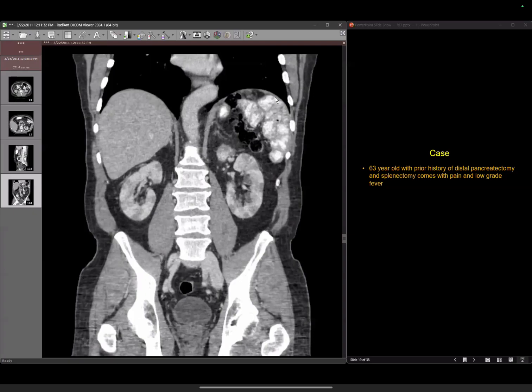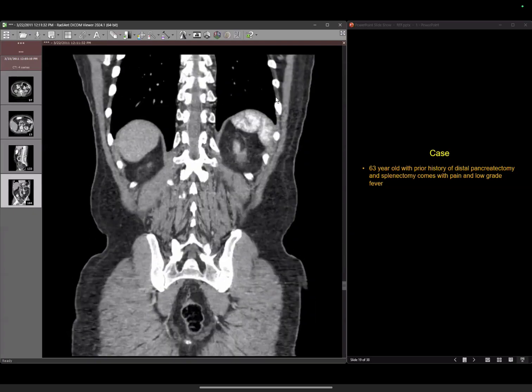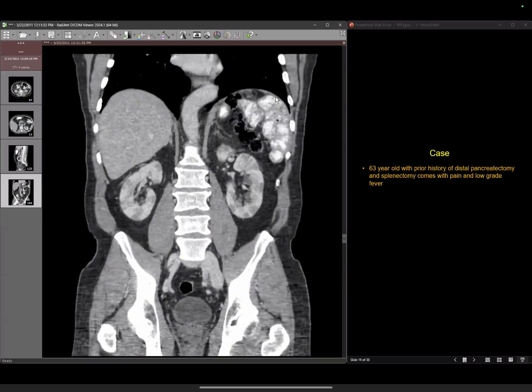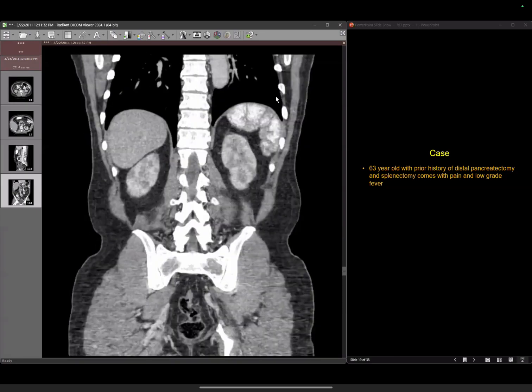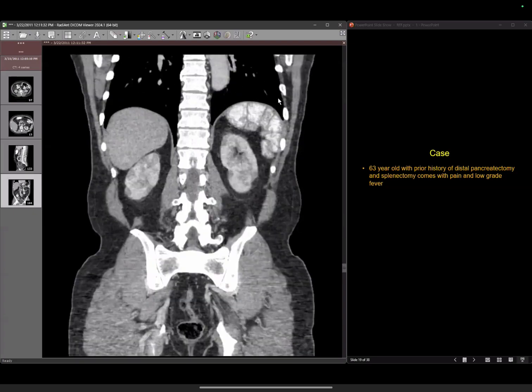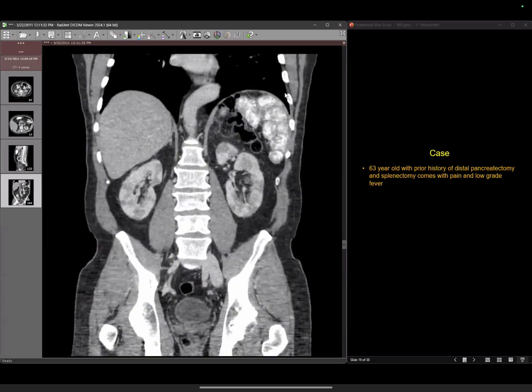Are the kidneys normal? So kidneys are showing multifocal areas of decreased uptake, or ill-defined areas bilaterally. Good, excellent. So now, what would your differentials be if you see something like that? So most likely, it could be an infection.